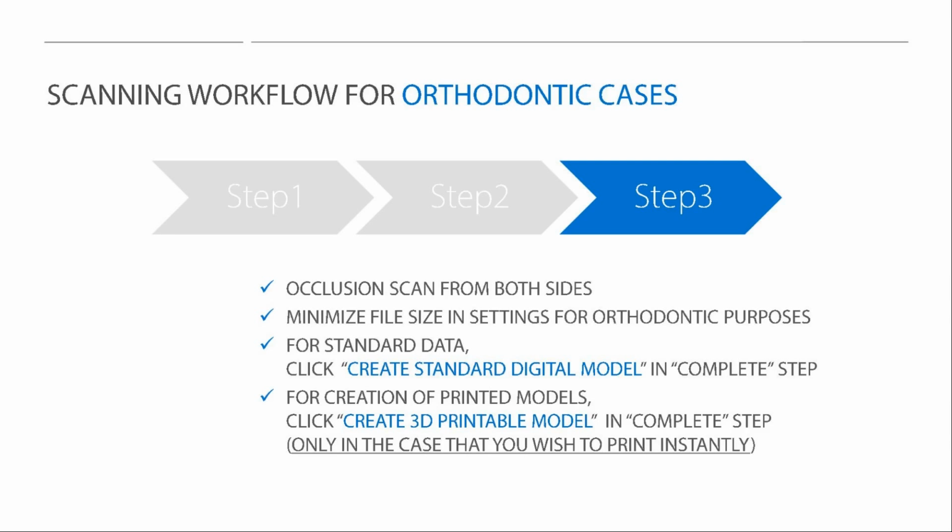What you should pay attention to is that if you're going to send the case to be designed for orthodontic restoration, and of course you will print orthodontic models, never use the create 3D printable model, because it will be harder for the dental lab to cut the base and put their own, and they will distort the data.